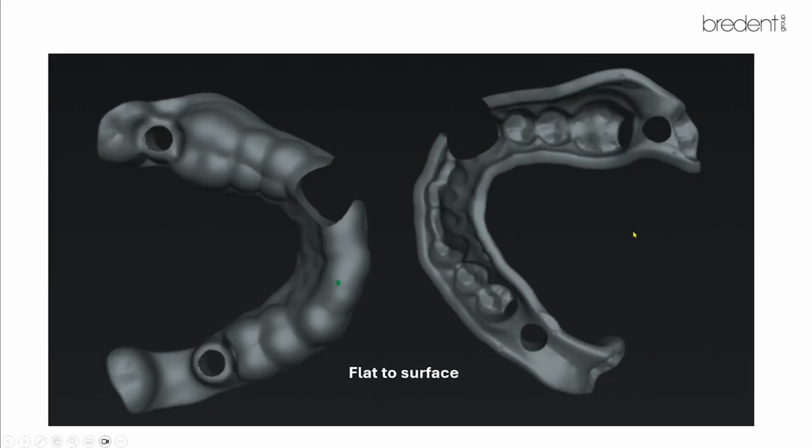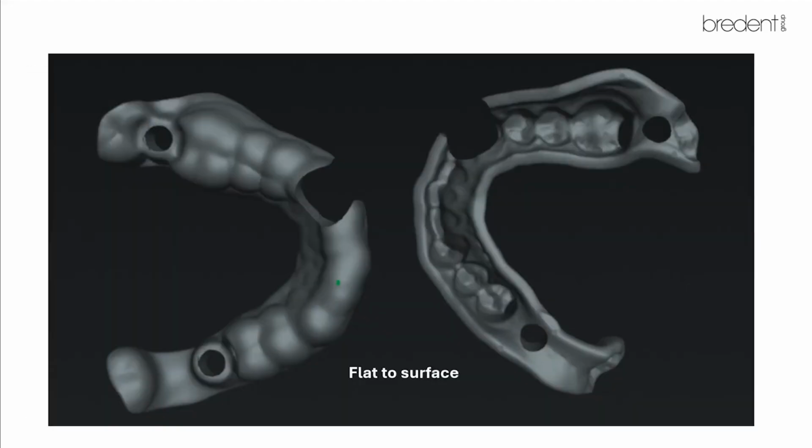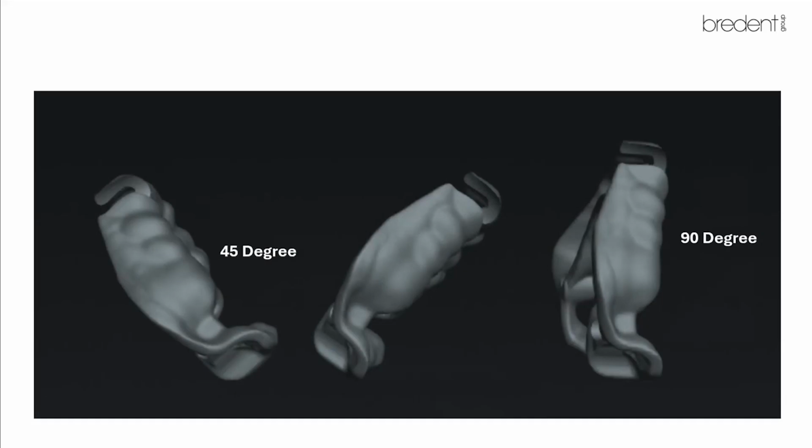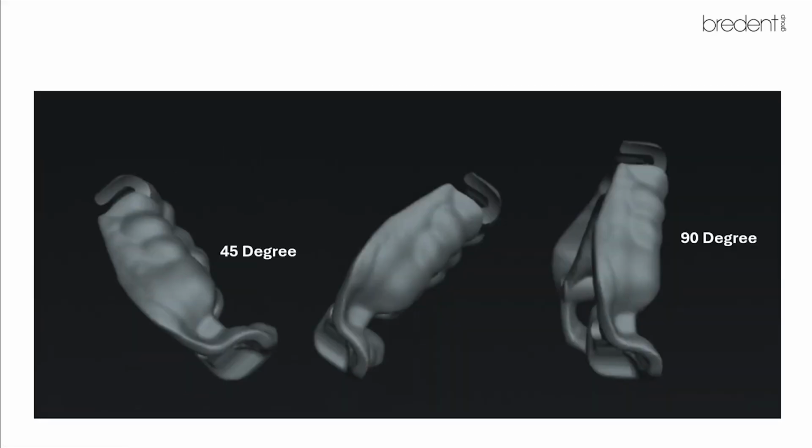But if you want to print too many, then you can also have 45 degrees or 90 degrees. But it takes more time. For a surgical guide, it is okay. Accuracy is acceptable. But still, if you want more precise, I think a flat surface works well. Otherwise, 45 degrees or 90 degrees, this is how 90 degree supports will come, which I don't like much because it gets into the sleeve area and all. But you can print many guides, depending on the size of your plate, around 7 to 15 guides at a time.